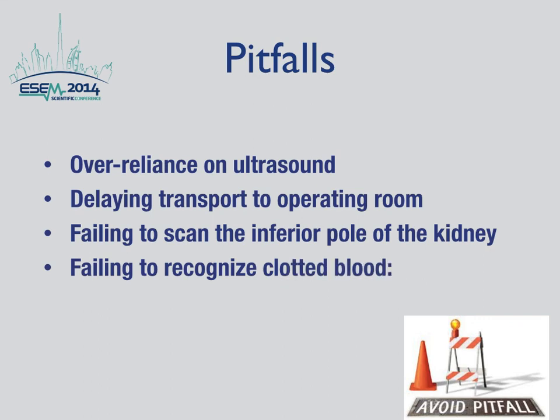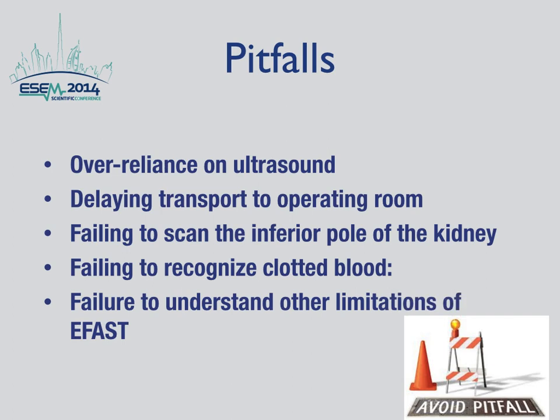Another pitfall is failing to recognize clotted blood. Patients with delayed presentation after thoracoabdominal trauma may have clotted blood rather than fresh blood. Therefore, the sonographic finding will not be anechoic or black, and they will have some echogenicity. Another pitfall is failure to understand other limitations of the EFAST exam. Morbidly obese patients and those with massive subcutaneous emphysema are challenging to image with ultrasound. Also, an EFAST cannot distinguish fluid type and cannot differentiate ascites from blood.